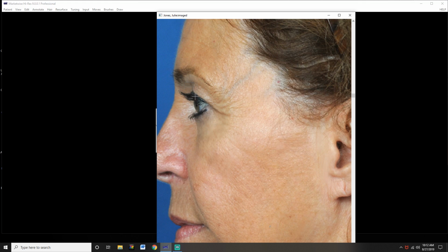Now, here's my upper eyelid, and here's the skin that's looping down over the top. I want to push that skin off to indicate the actual eyelid. So I'm making a box, and I'm pushing that eyelid rim skin back. And we're exposing the area underneath that skin that's looping down over her upper eyelid. We're exposing it, and now we're going to make it so it actually shows. Now you'll notice I'm making a series of boxes, pulling up that skin. I tighten the lateral skin as well.